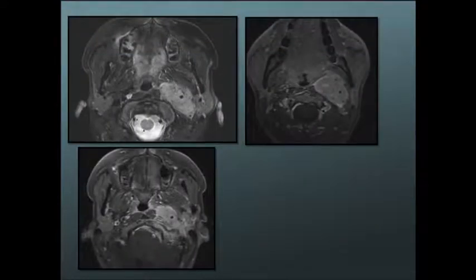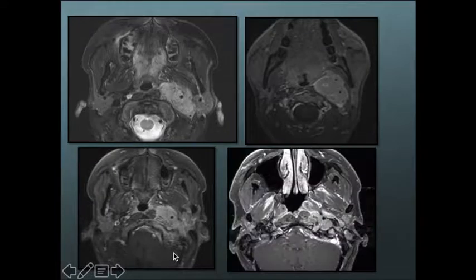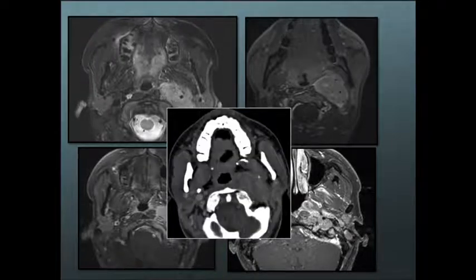Let me show you another challenging case. So you have a distal carotid space mass, somewhat homogeneous on T2, but maybe a few flow voids, avidly enhancing on the post-contrast images, and as you can see, it is extending to the skull base and even intracranially. So it looks a little funny. Could this be again like a glomus vagale? Definitely not. It is not. And actually, the answer is on this image with this dural thickening and enhancement.